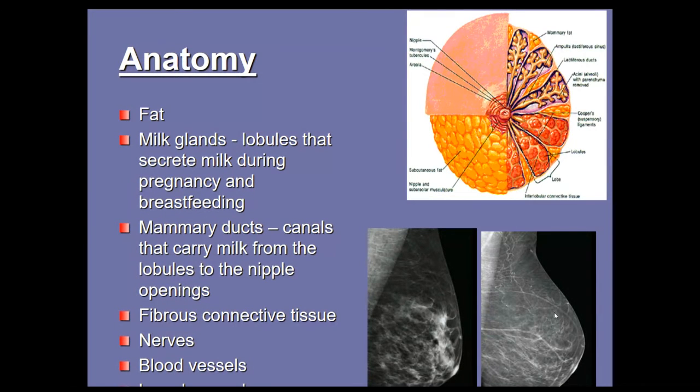After air, outside you can see this is air, this is completely black. After that, the black-gray structure is the fat. So this tells you that this breast contains more fat. This is a fatty breast because it contains more grayish color.